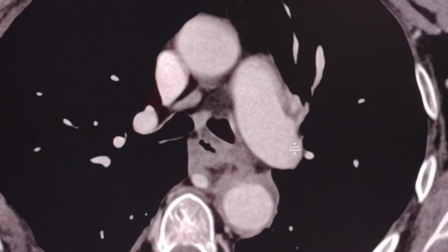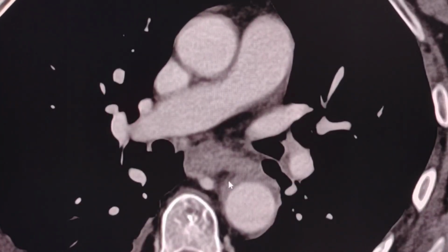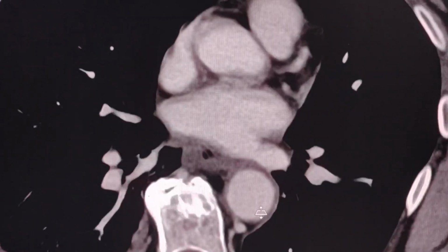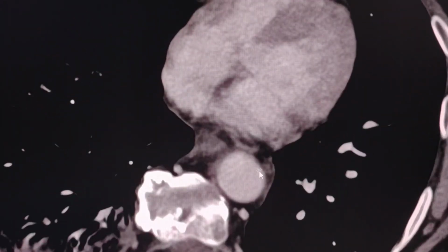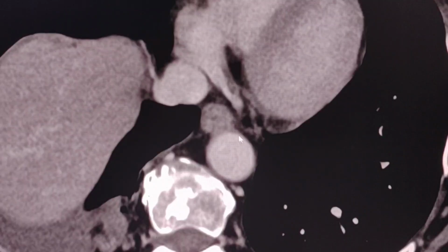Let's zoom in. I will go down, and all this abnormality stops somewhere in the distal thoracic aorta, and as we can see here, the vessel regains its normal appearance.